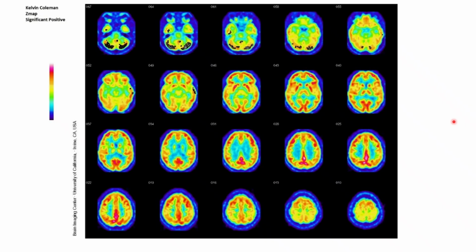The patient's cortex shows a normal rate of metabolic activity, but the patient has a decreased neocortical cerebellar activity ratio, and that's indicated by quantitative analysis. So what they're saying there is that this area is kind of abnormal.